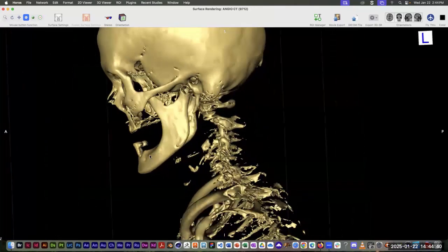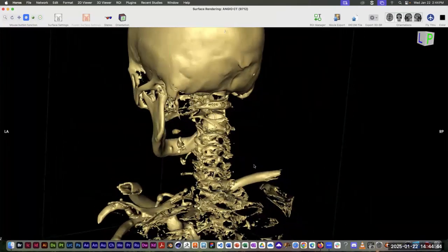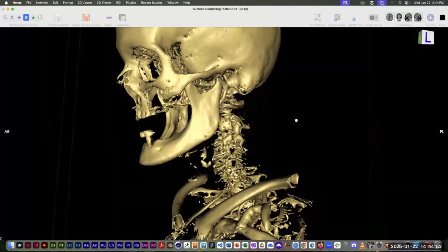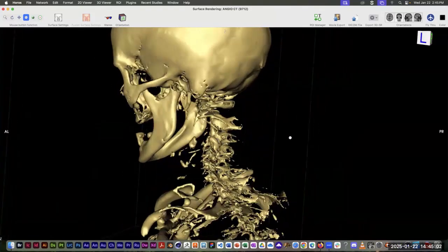So that didn't seem to do anything. Maybe very slightly better. So you can just keep doing this by trial and error and see what happens. The numbers range from like negative 500 to positive 500. So I keep reducing the number and really not getting a whole lot better.